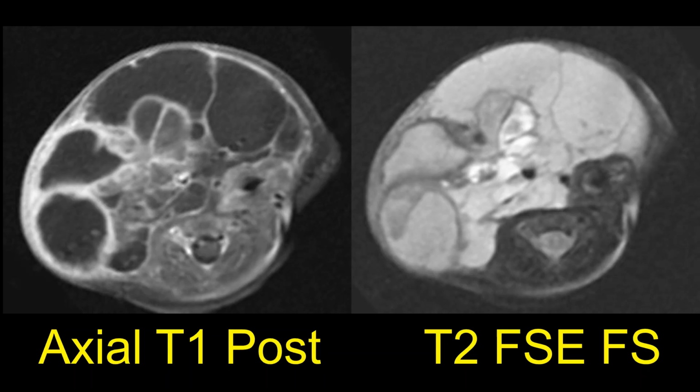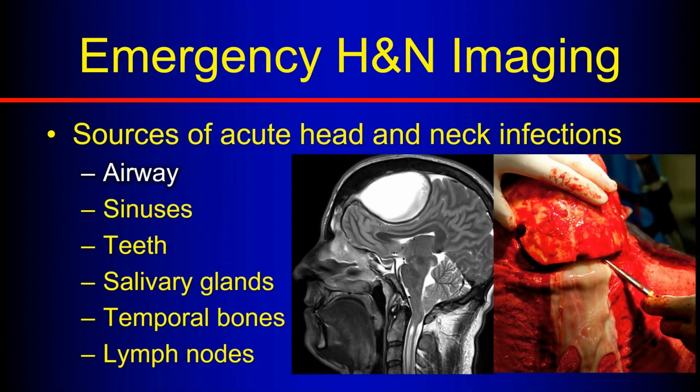So we have this huge spectrum of things that we might call venous lymphatic malformation, a big spectrum in between these. But these are transspatial masses that can get infected, like we see in this case, where we see these inflammatory septations. You see those bright white areas on the post-contrasted image where the septations are inflammatory and infectious changes around this. So we have a couple of big areas in the head and neck world that we talk about. We'll start off first talking about the airway. And we have some big anatomic subunits that we talk about that are especially important with cancer, the upper digestive tract.